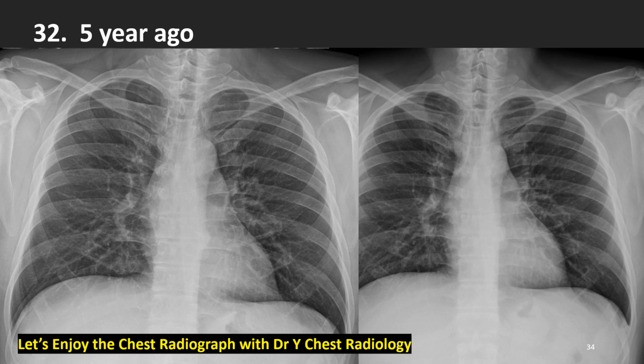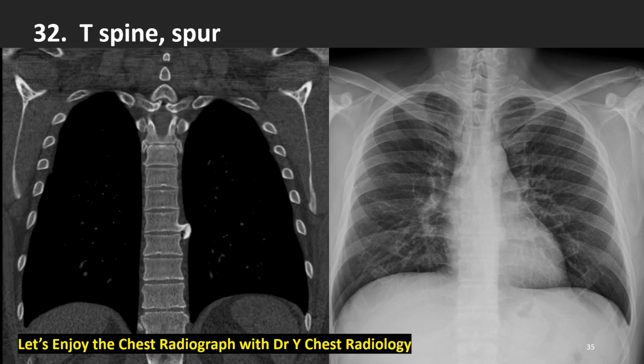Five years ago, it was there too. Same size, same findings. What is that? Is that a posterior mediastinal tumor? A paravertebral compartment tumor such as a neurogenic tumor? Let's check it out. This coronal CT of bone setting image shows the answer. Yes, it's the hypertrophic spur of the thoracic spine.